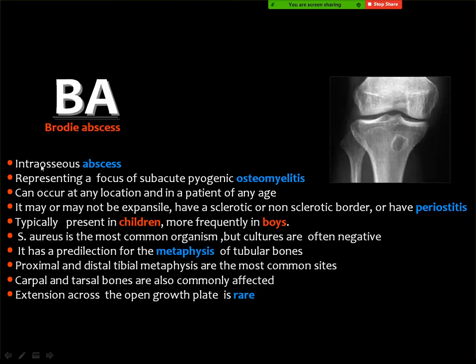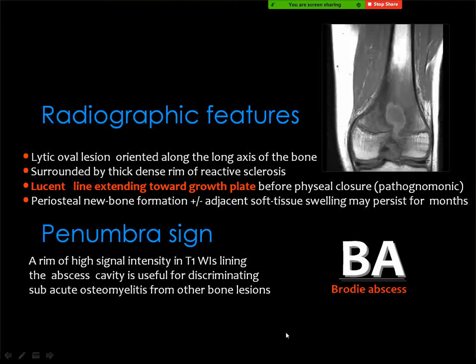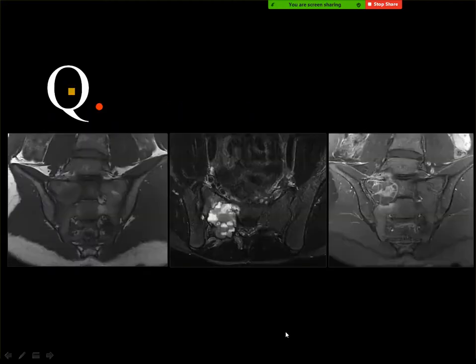This is an intraosseous abscess, a form of subacute pyogenic osteomyelitis, usually seen in children, particularly in the metaphysis. Extension across the growth plate is not common, but if you see this sign, it's relatively pathognomonic for this particular lesion.